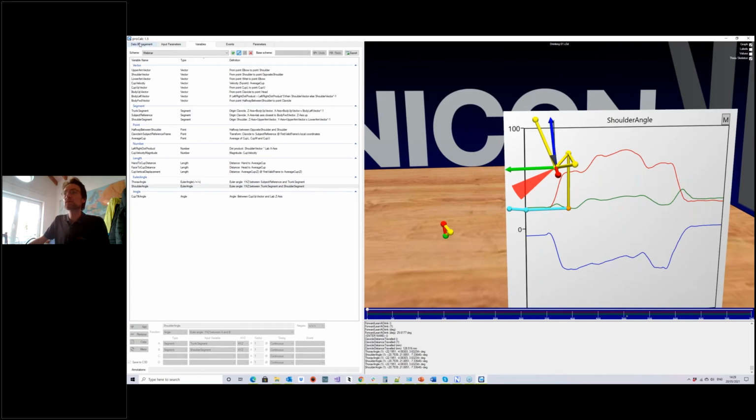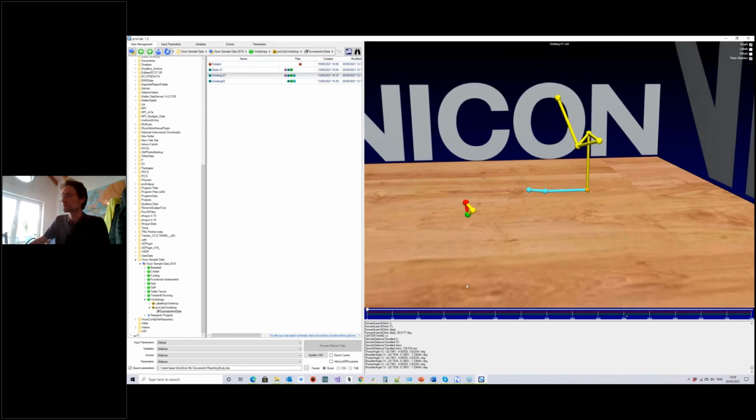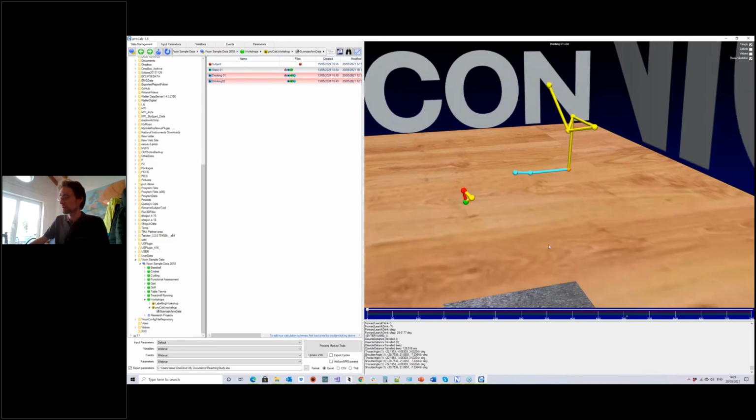So now comes the exciting bit, because now I have my trials from my 100 different subjects, for example, and I have my schemes: variable scheme, event scheme, and parameter scheme. I could go ahead and calculate all these inside ProCalc here by marking the trials in like so, and just hitting process marked trials. I will not do that just now, because I'd rather do this inside Nexus.